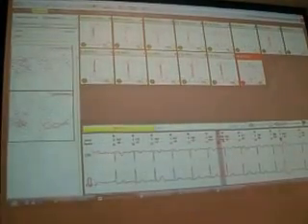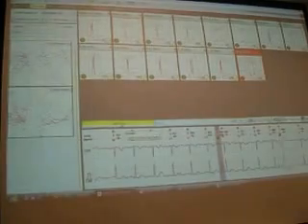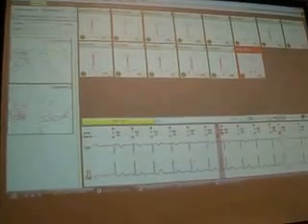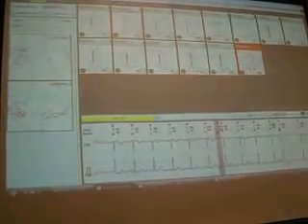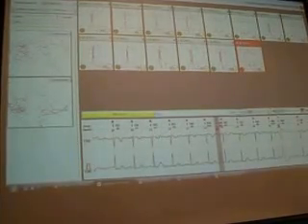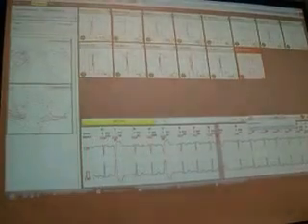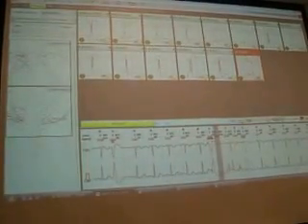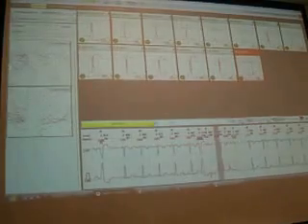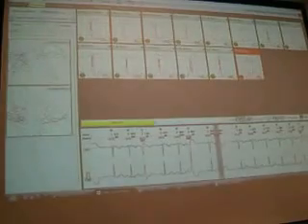This is the cluster, and this is the first QRS in the cluster, and we can check if this is a noise. The next QRS is ventricular. I fix it. Next is a noise. Next noise. Noise. This is ventricular.